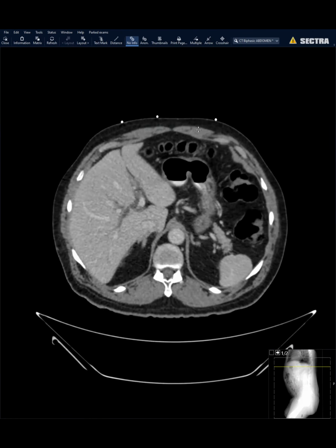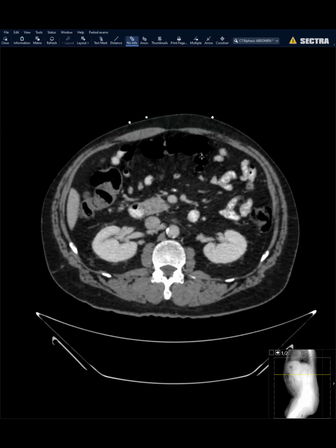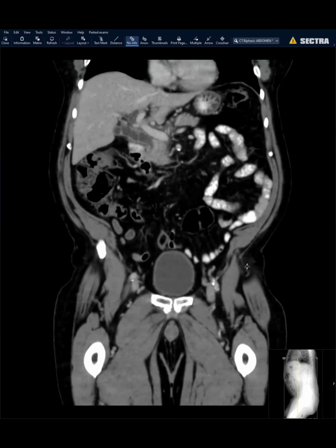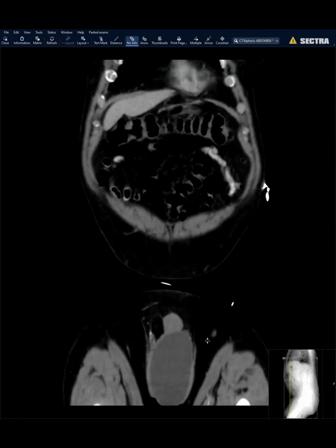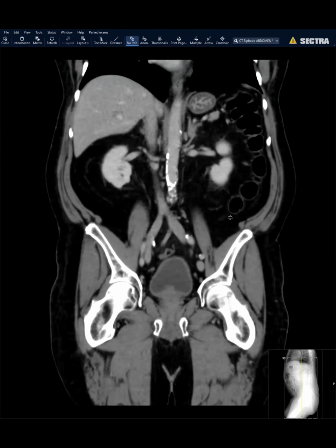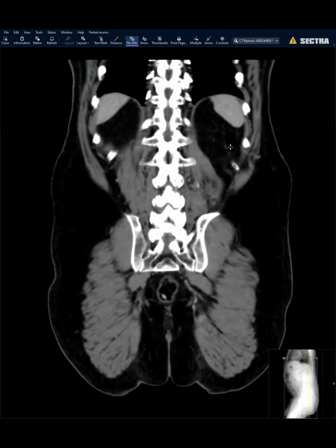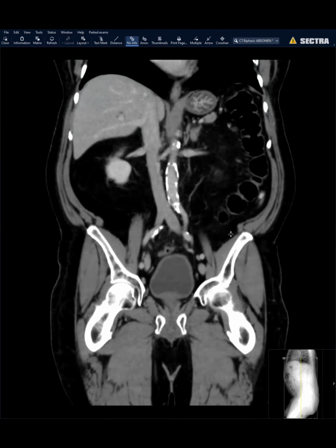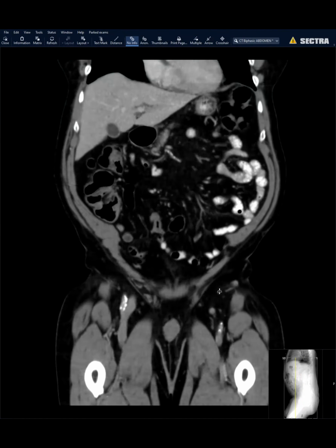And any clues like what you think of right now? Do you have a coronal to show us? I do. Can you stop on the bile duct?